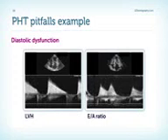Here on the right-hand side, everything is quite clear. We have a relaxation pattern, so this patient does have diastolic dysfunction. In addition, we see that the patient also has left ventricular hypertrophy.